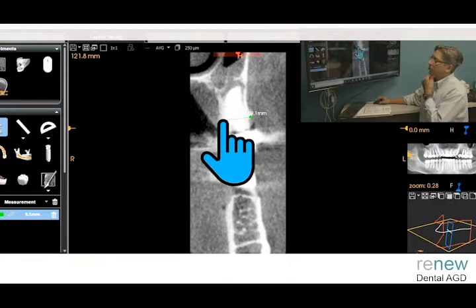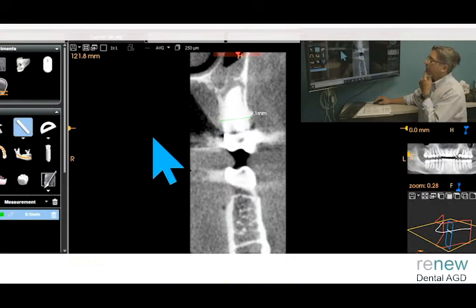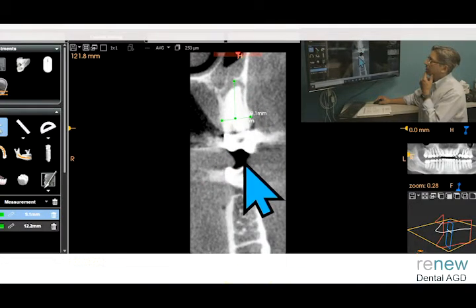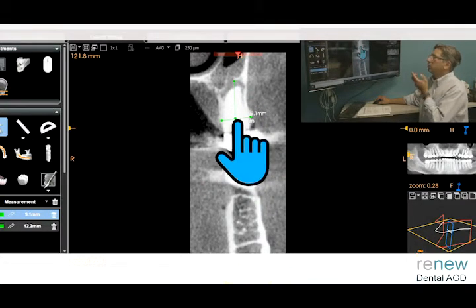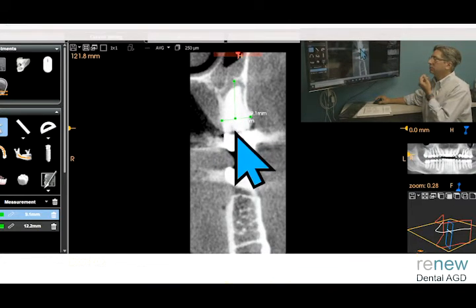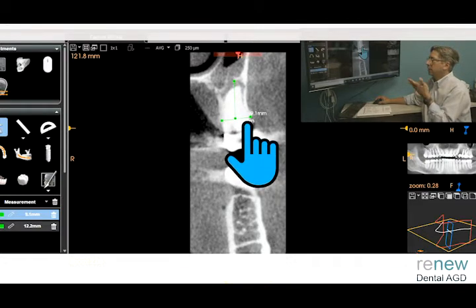And then your tooth length looks pretty easy. It's probably a 10 once that's healed up. So that's a 12.2. So I expect you're probably going to do a 10, no longer than an 11.5 in this site. You got plenty of width, so that shouldn't be a problem either.